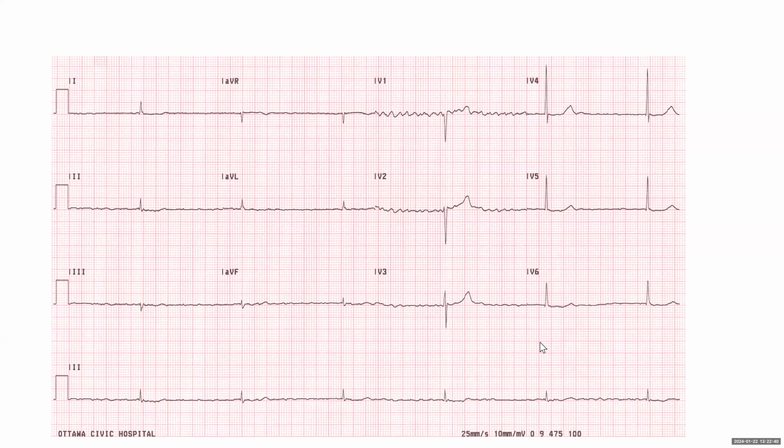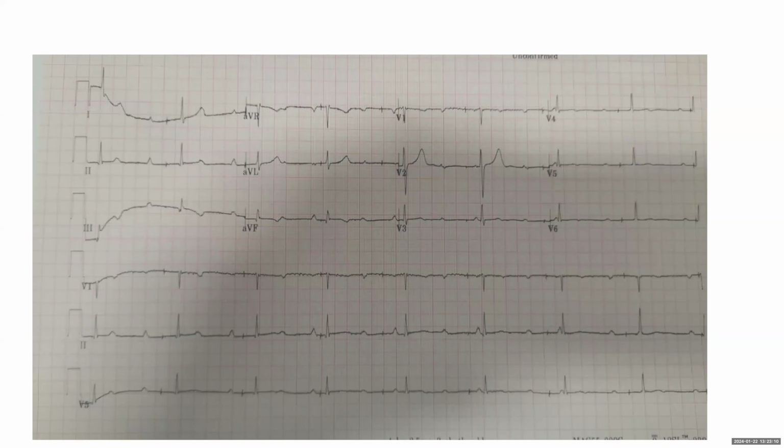No. Sick sinus syndrome, this is, I think, what you meant, Hamid, by SSS. Sick sinus syndrome means that the sinus node is dysfunctional. So it goes from AFib to sinus bradycardia. Here, you cannot make that diagnosis because we haven't seen sinus rhythm. So we don't really know. Okay, excellent. Moving on to the next ECG.